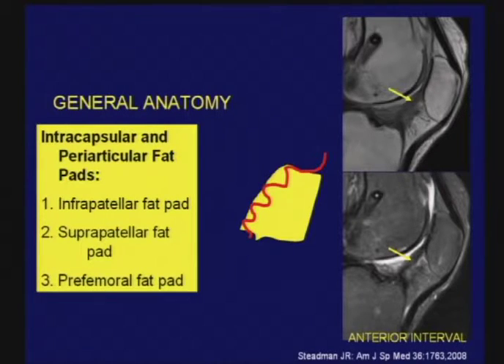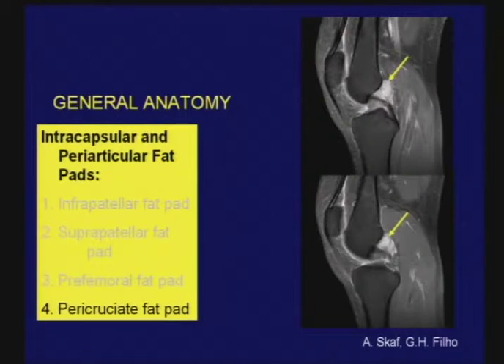One other point that I would like to make is the occurrence of fibrosis in this area, pointed out by the arrows. This is the interface, again, of the synovium and Hoffa's fat pad. It is sometimes called the anterior interval of the knee. There have been some reports in the orthopedic literature that this is a significant pattern of fibrosis, generally seen following arthroscopy, as in this case, and may lead to restricted knee motion. So we generally indicate at least involvement of the anterior interval of the knee.